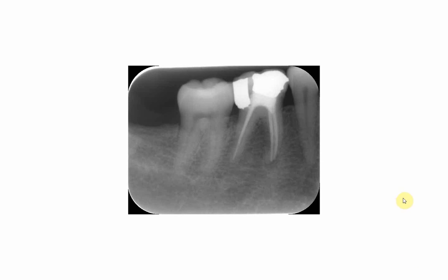Another tooth, lower 6, which is root canal treated, and here you can see the amalgam filling. We can hardly say it is an MO filling because it doesn't fall under the category of an MO filling. However, there is a large filling on the occlusal surface, and then there is another separate amalgam filling present on the distal surface of the tooth. The two fillings are apparently either a broken filling or two fillings that were incorrectly placed.